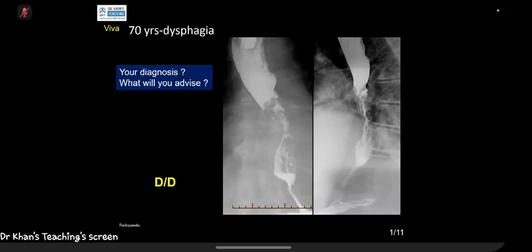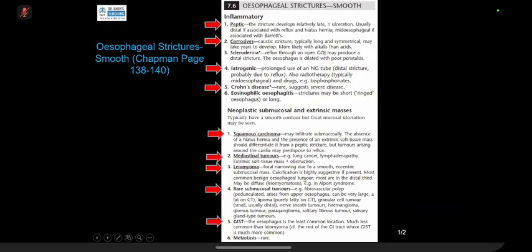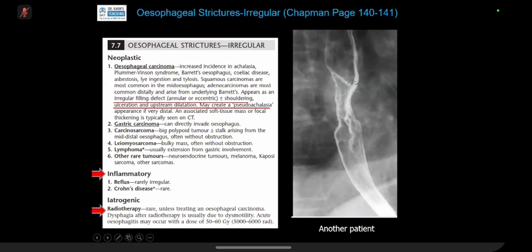On the other hand, look at this one. This is malignant. In malignant stricture, may it be esophagus or anywhere in the gut, you see mucosal destruction on a barium examination. You see overhanging edges, we call them overhanging. Look at this mucosa. This is destroyed. And you can see these overhanging edges. Let me go back and look at this one. This is smooth. And another one where you can see this mucosal destruction.